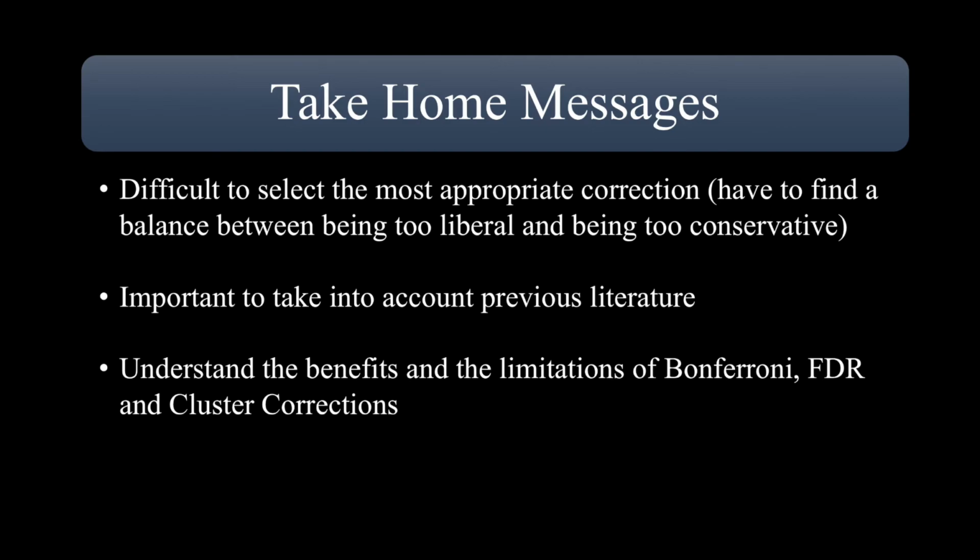The aim of this tutorial was not to impose any definitive idea of the ideal correction method, but rather to show you the benefits and limitations of each of the three different methods: Bonferroni, false discovery rate, and cluster correction. Furthermore, the important point to note is that in most cases, corrected data is preferred to uncorrected. Therefore, it is important to understand the unique merits that each of these methods brings to different datasets.